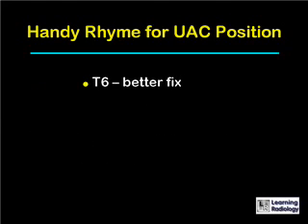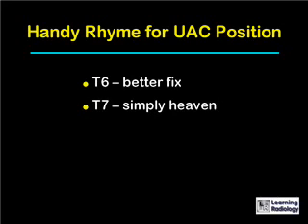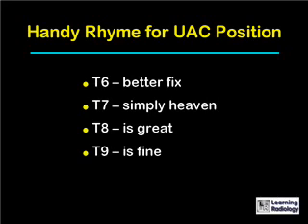So here's a handy rhyme to remember the correct positioning for the umbilical arterial catheter. T6, better fix. T7, simply heaven. T8 is great. T9 is fine. T10, try again. That's not original to me.